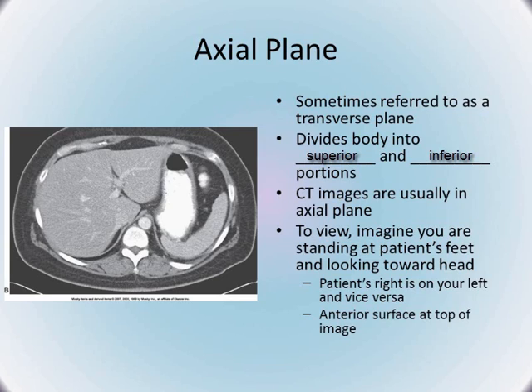To view the images, we're looking at this image as though we're standing at the patient's feet and looking toward their head. So their right is on your left and their left is on your right. The uppermost aspect of this image is their anterior surface, and the bottom of it is their posterior surface.